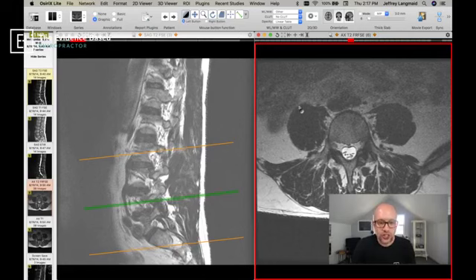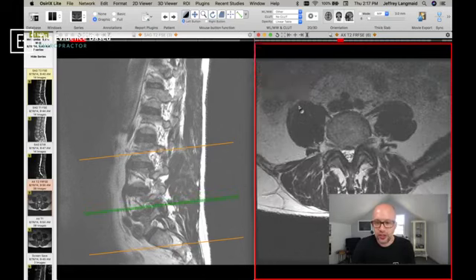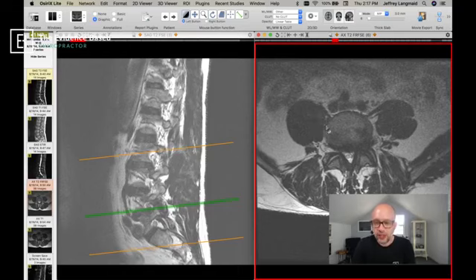And if we go down into where that pinched nerve is on the foraminal canal, here is what we will be looking at. That is a disc right there. This is the central canal. It is not perfect, but that's not our focus today. It's a little small. This is a facet joint or a little knuckle on the back side of the spine. You may have heard about the facet joints. This is the other one, and this is the back side of the bone going out here.